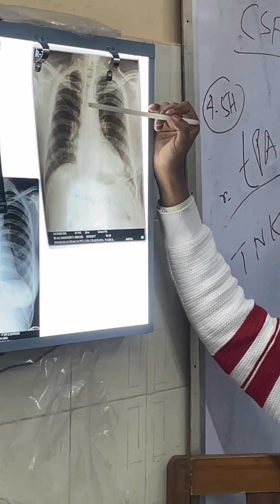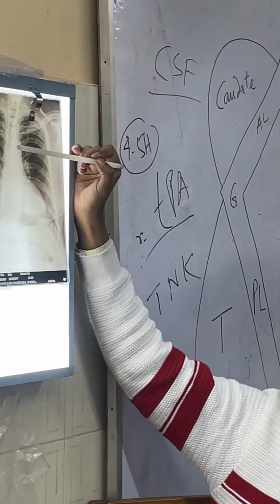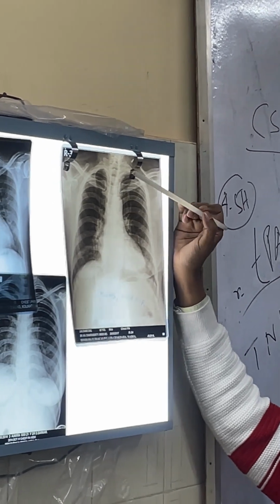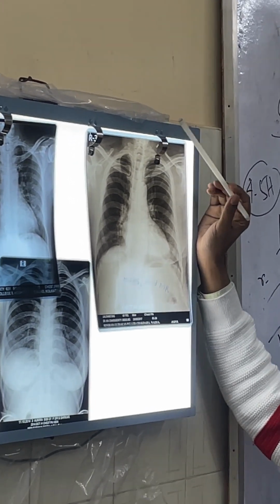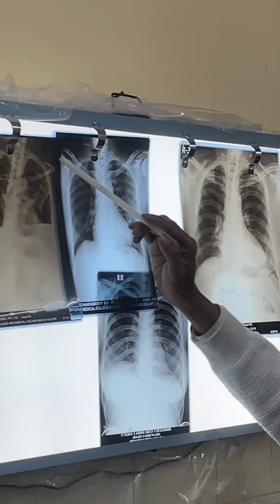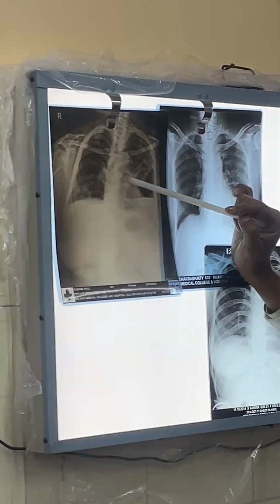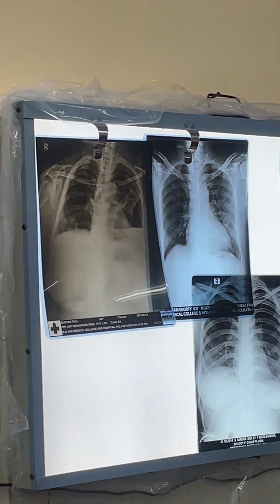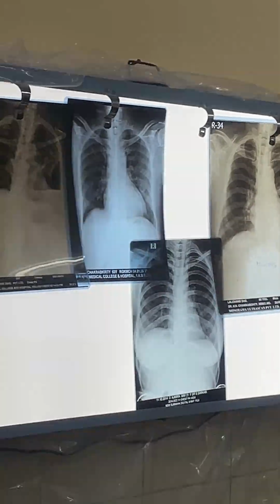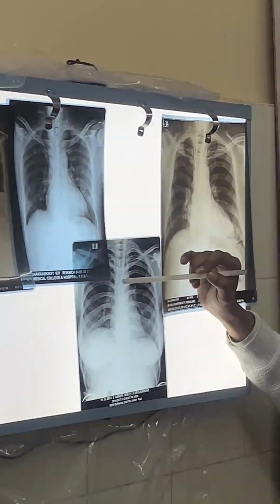So this is the airway. What is the name? Trachea. Trachea is coming, and there is the bifurcation into right and left. It is not predominant here. Now come to this slide. The trachea is coming. Come to this side. The trachea is coming, there is the left and right, so the bifurcation is clear here. Trachea is coming, the right and there is the left.